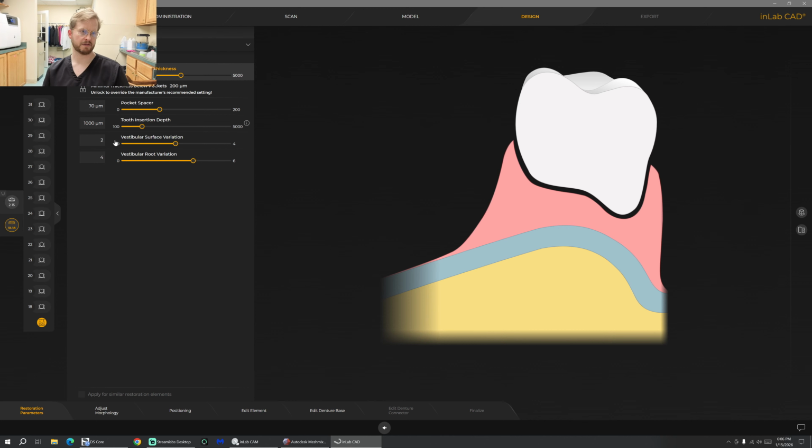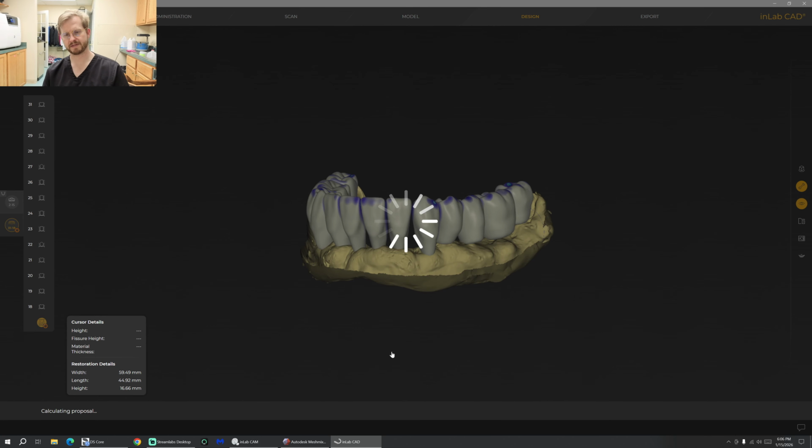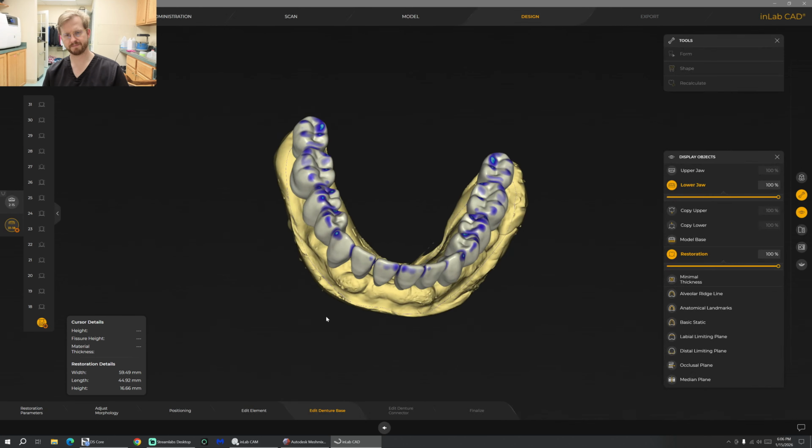I'm gonna turn the thickness way down and see if maybe it's just a model problem. There might be something wrong with the model. See if it will compute at all. Yeah, I'm gonna have to take it in the mesh mixer and look at it.